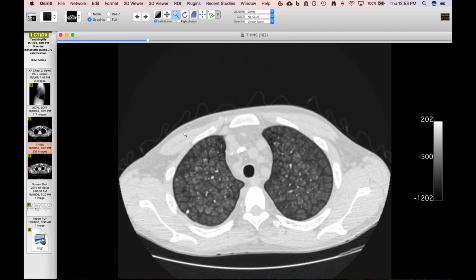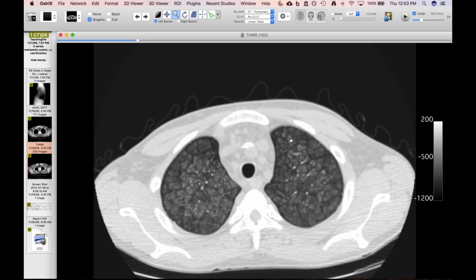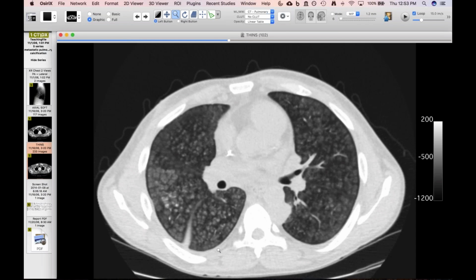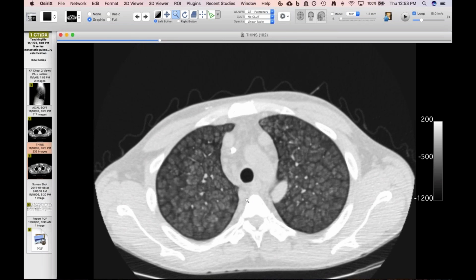Oh yeah. Gorgeous. Now this one, there's a little bit more confluent calcification, but to your question, David, you still don't see anything really, with the exception of a couple little flecks on the soft tissue windows. But this also has that upper lobe predominance from the difference in oxygen tension and difference in pH causing precipitation.